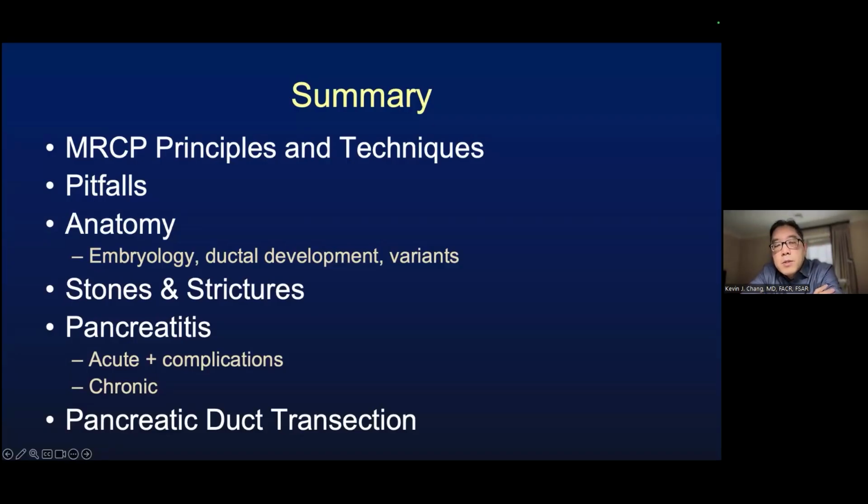It's a feature that we can see in the setting of chronic pancreatitis. I think it's up to the gastroenterologist whether it's something that they want to go in and try to fetch a stone for. I guess it depends on whether they think that the patient might improve after retrieving a stone from a pancreatic duct in somebody with chronic pancreatitis. I've seen it left behind in many cases.